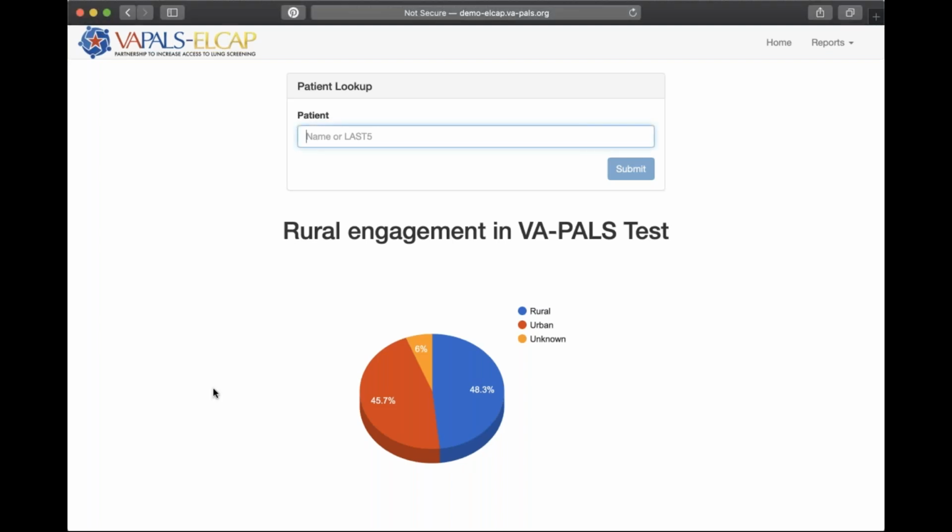So this is the opening page of the VAPALS ELCAP software.